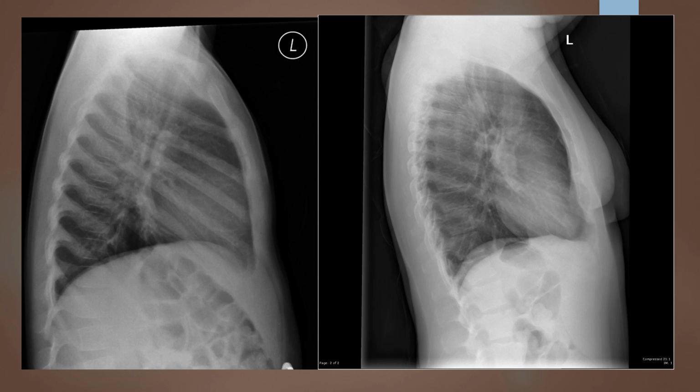We have our apex to angle to angle to apex. All the anatomy is there. We're going to check the legalities right off the bat. We see we have a digital marker. That is not great, but we're going to check the other legal components. I'm not going to go over those again, but we're going to go ahead and go with our technique evaluation.